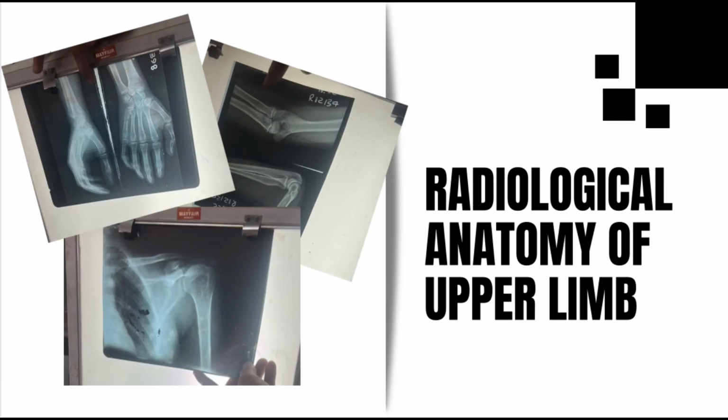Radiological anatomy of the upper limb for the anatomy viva, in which we will be having the x-rays of the shoulder region, the x-ray of the elbow region, and the x-ray of the hand.